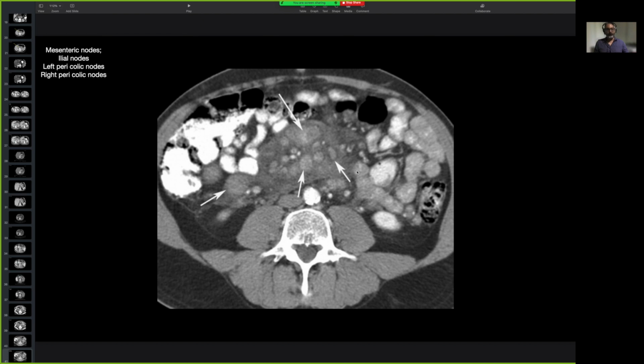You can also consider this the jejunal, but you can see lymph nodes. So this is your ascending colon. That's the descending colon, and that could be pericolic lymph nodes here, right pericolic. And I believe there would be lymph nodes here also, left pericolic lymph nodes. So these are ilial nodes. Could be jejunal nodes slightly up on this side, and left and right pericolic lymph nodes.